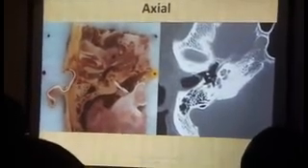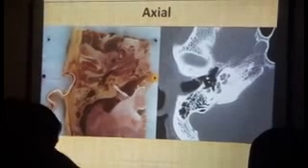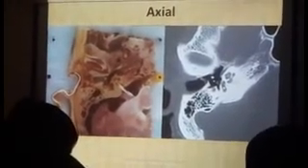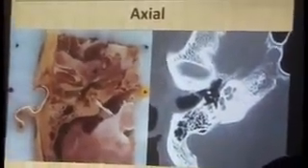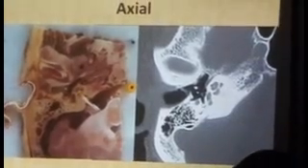And we can see that at the base of the stapedial superstructure obviously lies the footplate of the stapes, which in turn lies on the vestibule. Not only that, the facial nerve is here. This is your facial nerve here, right? It's housed within the pyramidal process.